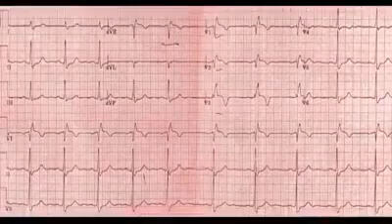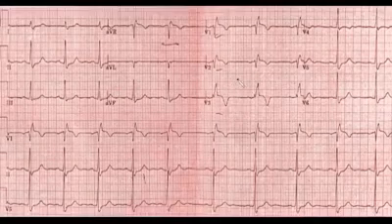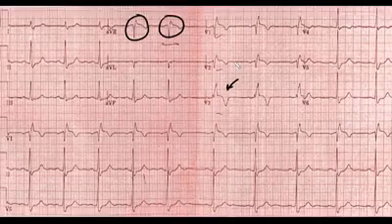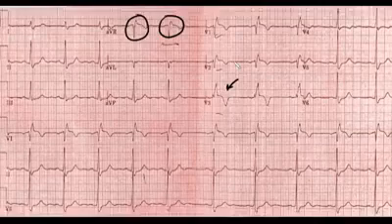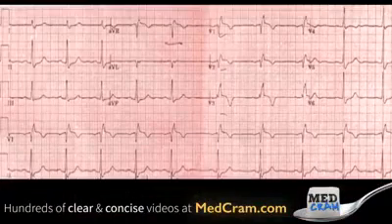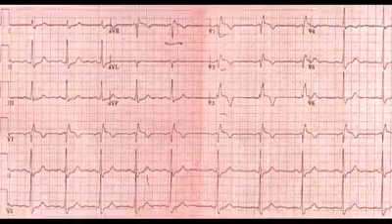And now on the second EKG, notice in addition to our ST segment elevation that we already talked about, look here again, AVR with significant ST segment elevation. And this, in the appropriate clinical setting, which is what we typically see, is consistent with and concerning for an ST segment elevation myocardial infarction. So generally what you want to see is two contiguous leads with greater than 1 millimeter ST segment elevation.